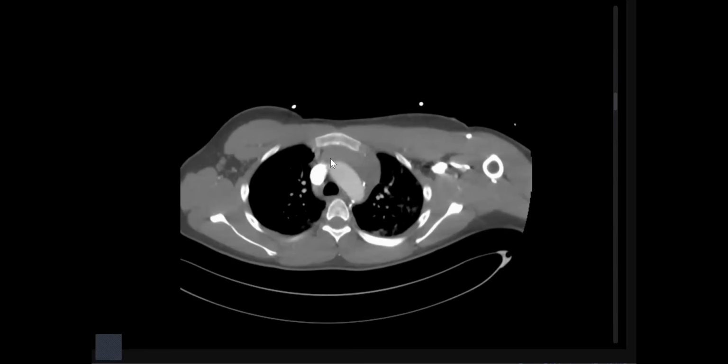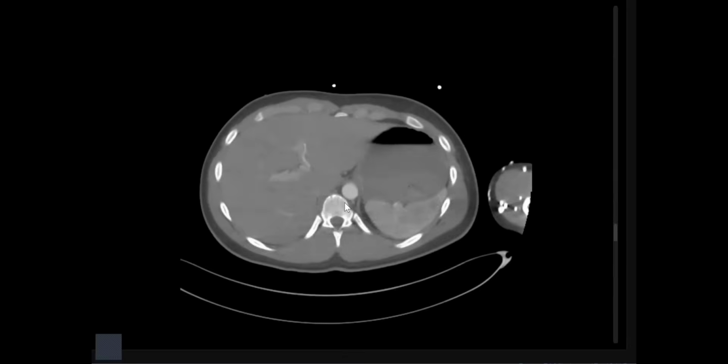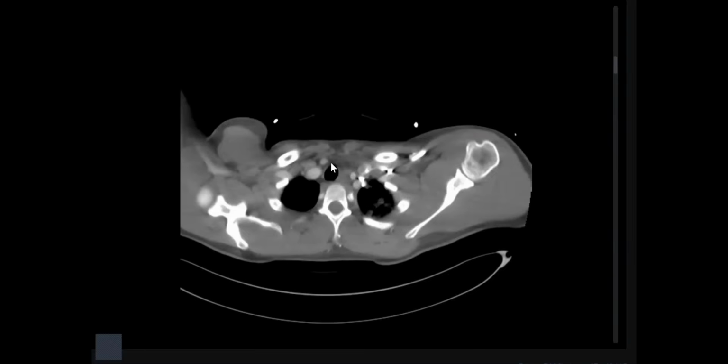You mentioned the mediastinal hematoma later. It should be earlier. And again, if any mediastinal hematoma, don't forget IVC. Of course, in my routine practice, lung and soft tissue window. Okay, well done.